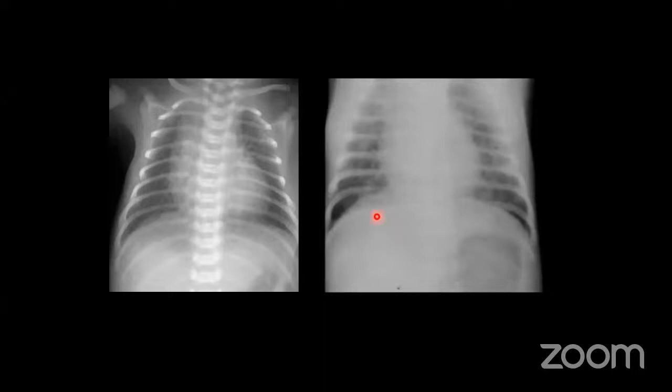Already you have seen this central fanning from the hilum, and you can see the obliteration of the costophrenic sulcus by effusions. You can see the visible transverse fissure. So fanning from the hilum, the visible transverse fissure, and the pleural effusion are the radiological hallmark of transient tachypnea of the newborn, and there may be a marginal increase in the volume of the lung.